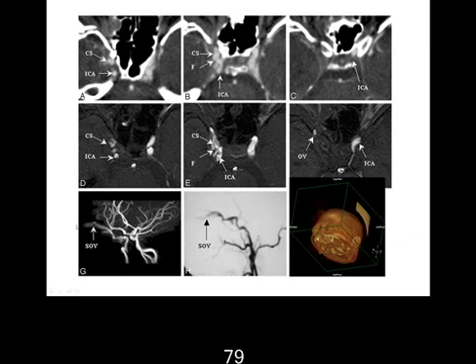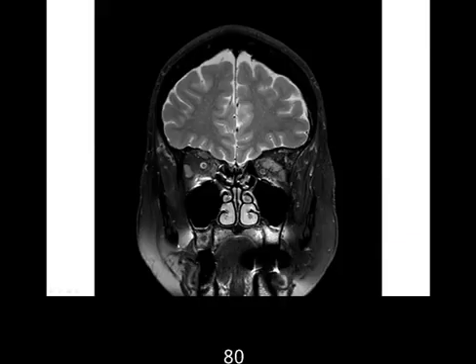This is an angiogram. The nose is this way. The patient is looking that way, and in that area the artery is so prominent compared to the other side because there is so much blood flow to the area. So this is the orientation.